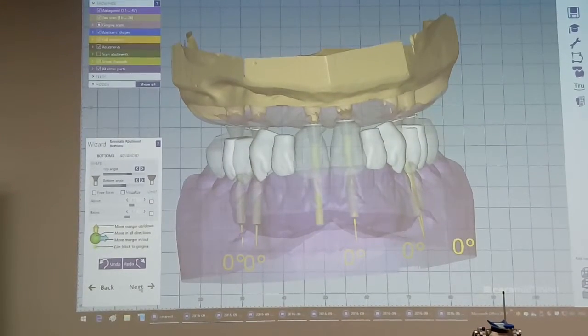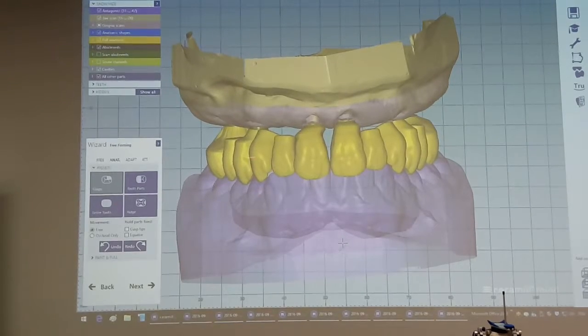Here we click to the next because we don't create the buttons. And this is now still the case where we didn't change. It's just now that you can see the difference.